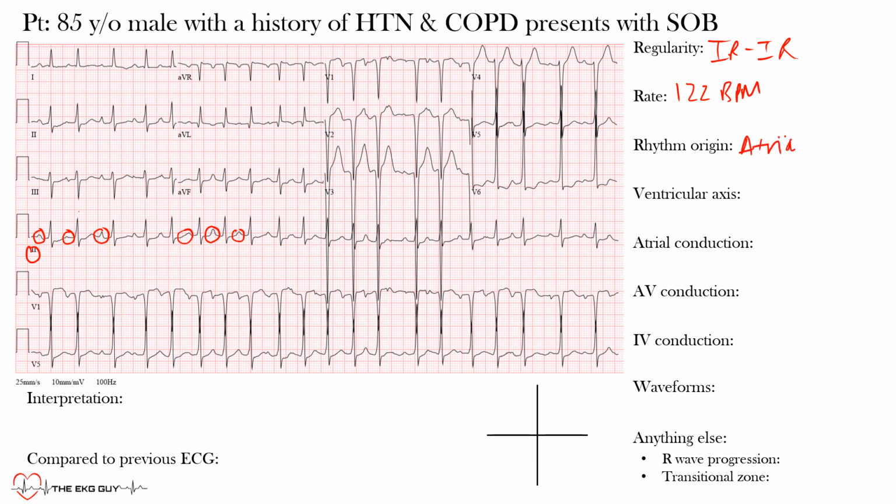We don't have a sinus rhythm because in sinus rhythm we want the P waves to have similar morphology, so that should make sense there, okay? But we have at least 3 different P wave morphologies, probably more than that here. So 3 different areas in the atria are starting the impulse in conduction down to the ventricles.